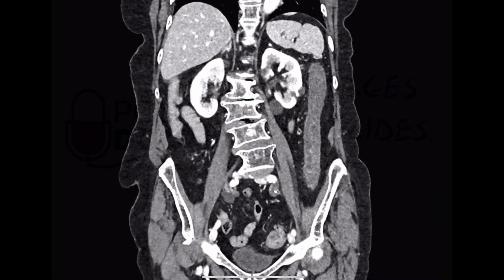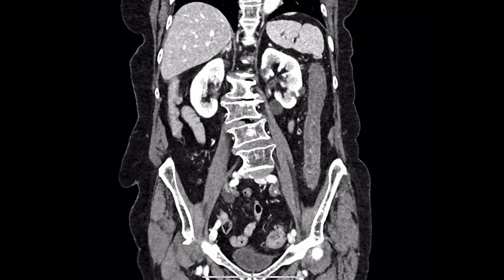Thanks for giving us your time to talk about some of these images. I think this is a CT colon. And I think there's trouble. So it's a CT abdomen, and we are seeing it in a coronal view. So the left side of the patient is here, the right here, and we're looking straight at the patient.